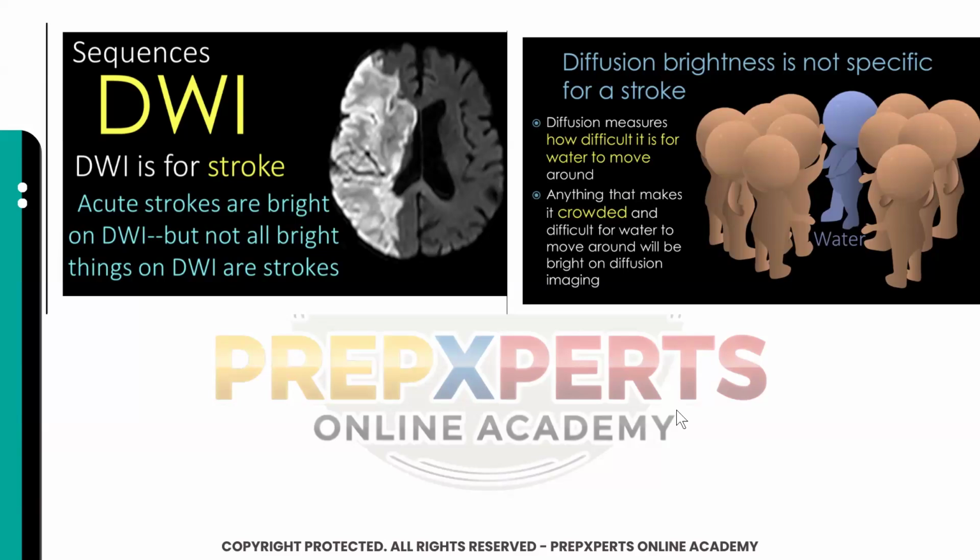For strokes, DWI is very, very important because whenever there is some infarction going on, as soon as the process starts, the earliest sequence that is able to detect stroke is DWI. It can detect an area starting to get infarcted within 30 minutes. Acute strokes are bright on DWI, but not all bright things on DWI are strokes. We will discuss that as well.